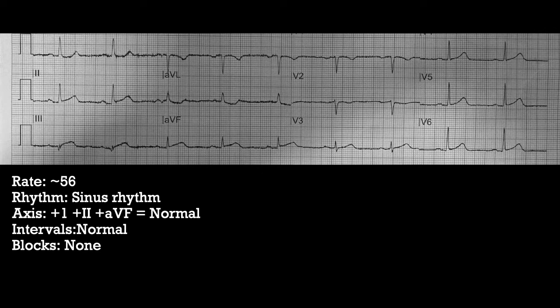Here it is. We see there's our TP segment. Looks fairly straight. And then that ST segment looks bumped up above the TP segment, maybe a little bit. And again, you can be fooled a little bit. It's a millimeter that makes it actually significant. When we look down here, that might be it. This one looks pretty convincing. That looks like that ST segment is a bit elevated. It looks like it's sort of doing that tombstone thing that we think about.